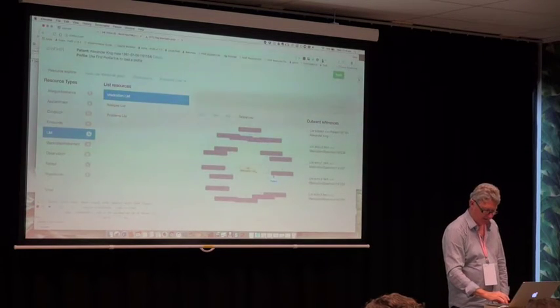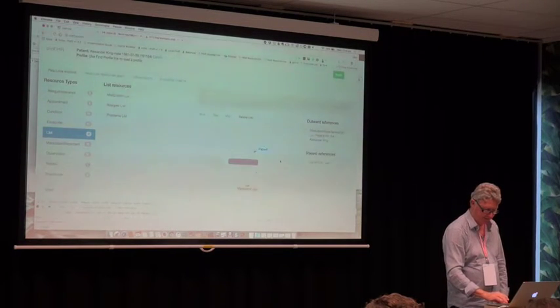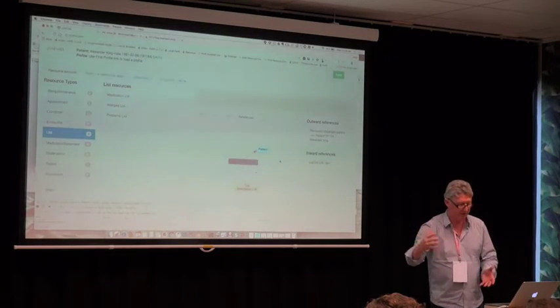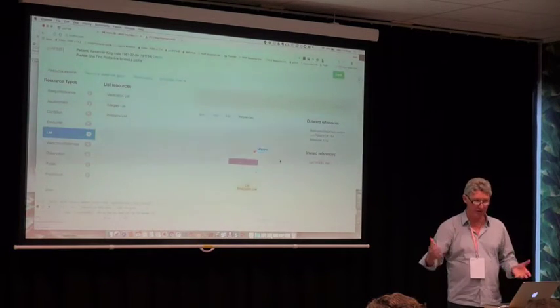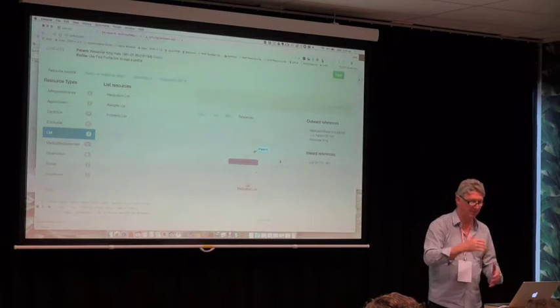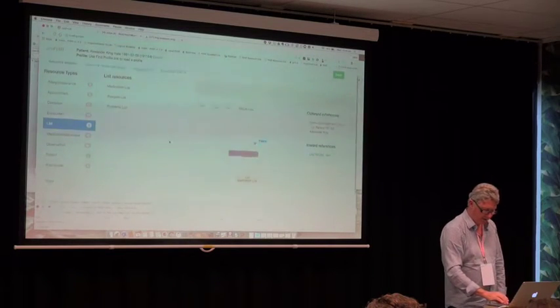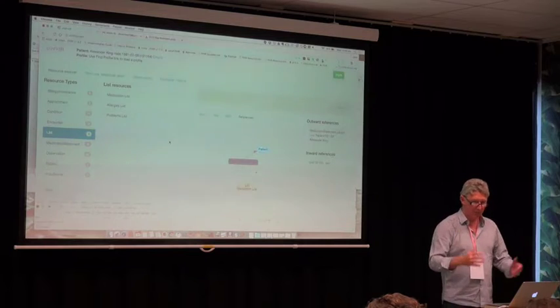And you can move around in here. I can select that medication statement there, for example. That puts it into context and shows the references that it has got, which in this case is a reference from the list to the medication statement and from the medication statement to the patient. So that's kind of looking to see what resources are in there.